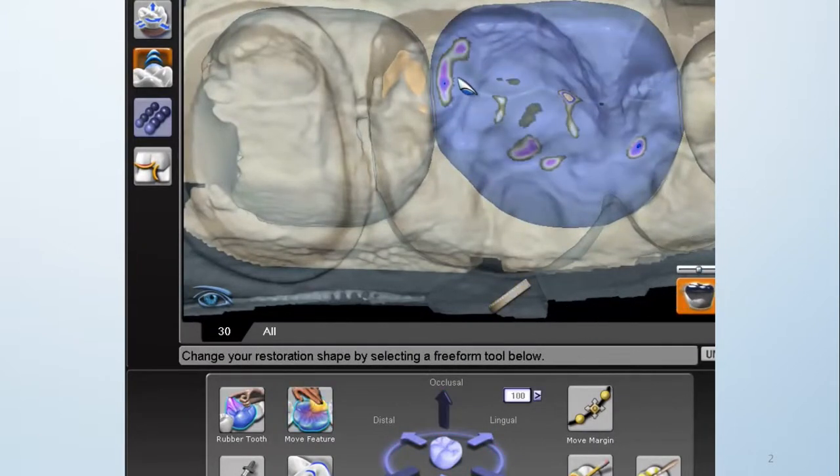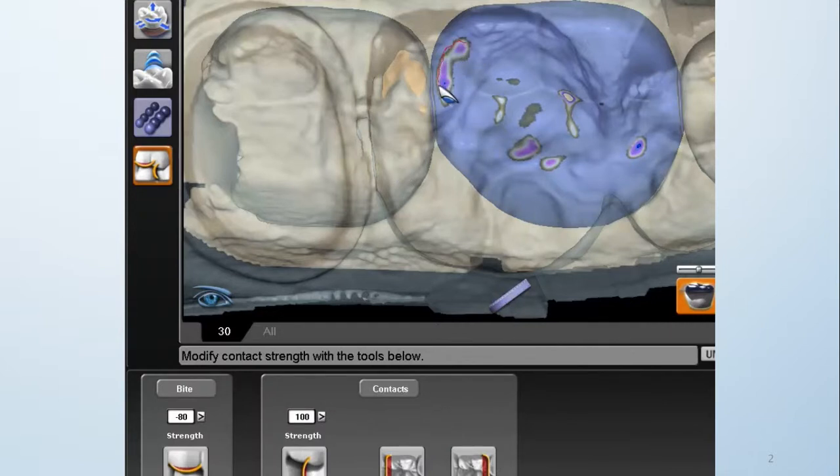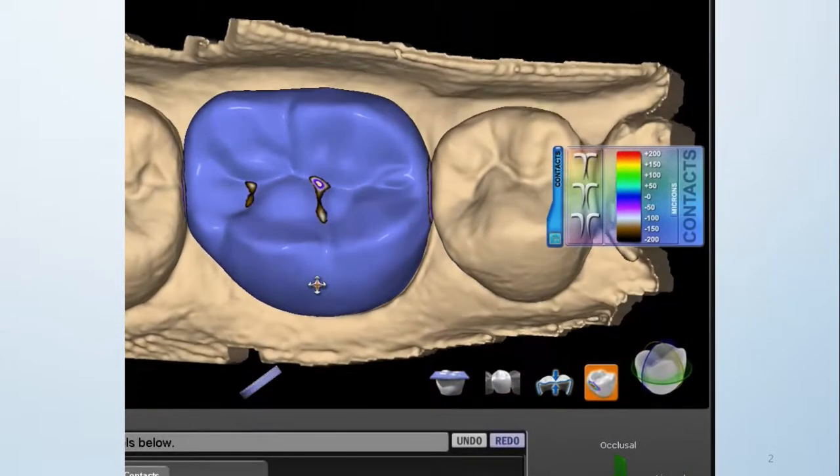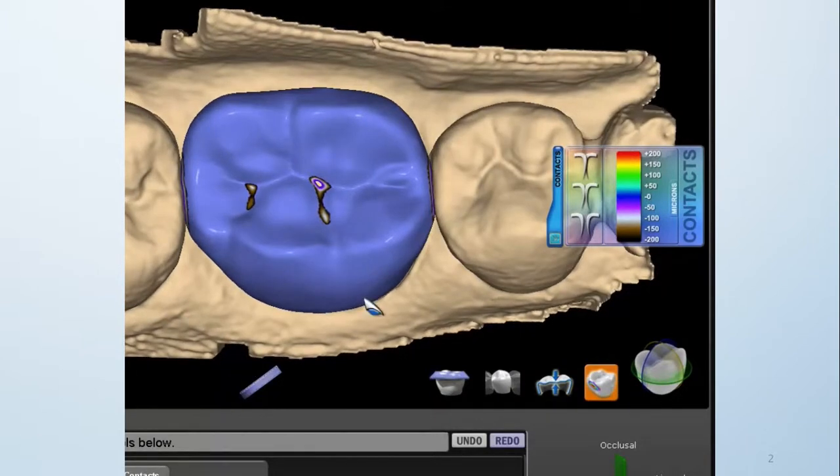Turn off move features, and now I can see much more friendly contact areas. Go to your contact refinement and make your little circle. And now it's adjusted that area by 80 microns, that area, this area. So it's been adjusted, but now do I see stones sticking through there? Aha, yes I do, which is exactly what I wanted to happen because I wanted to talk about this.